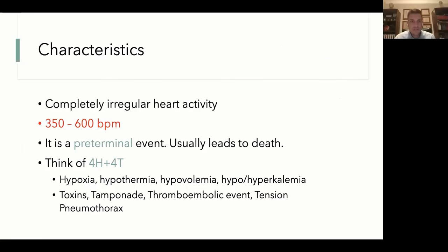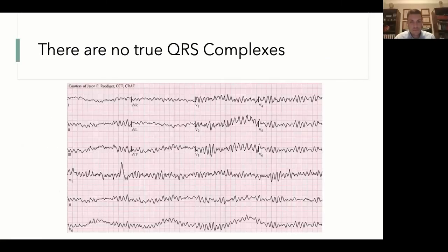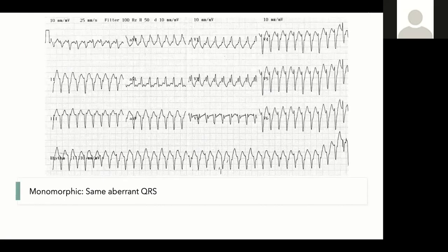Good. The other one you want is ventricular tachycardia. Do you mean monomorphic or polymorphic? Monomorphic. In monomorphic, you actually see the wide and aberrant QRS that looks exactly the same with every single beat. Plus, you will know it's a tachycardia because those are actually extrasystoles. They have the morphology of right or left bundle branch block.